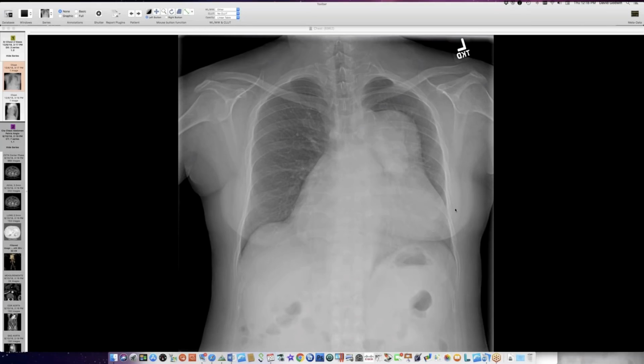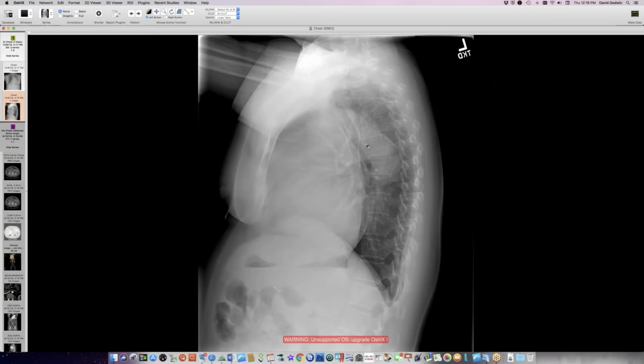So here's a young woman with an abnormal röntgenogram. Can you see the röntgenogram? Yep. He has this mediastinal mass here, and it's adjacent to the aorta, and behind it is another mass-like thing. And on lateral view, we can see that it corresponds to a very big left pulmonary artery.